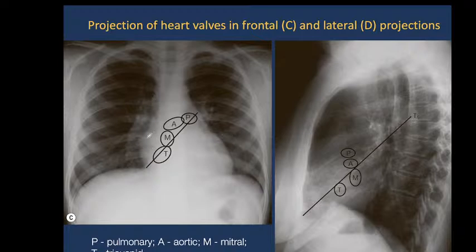This picture shows us the valves' position in frontal section, in frontal X-ray examination, and here is the position of the valves in sagittal projection. As you see, the letters mean the different valves.